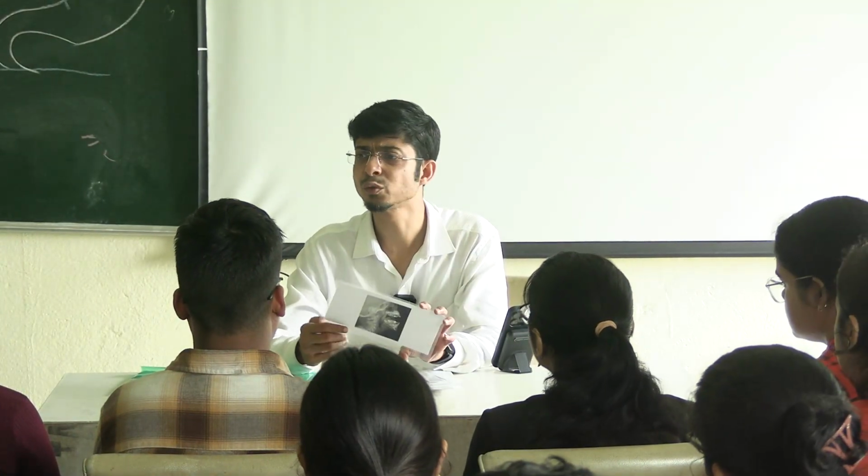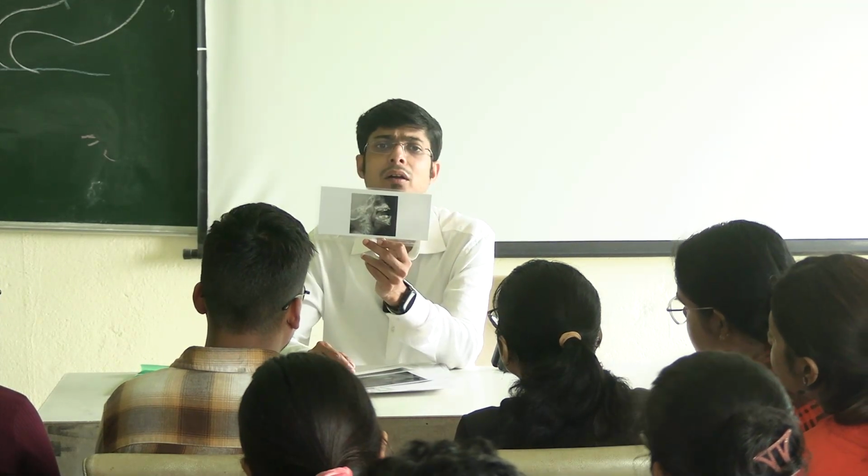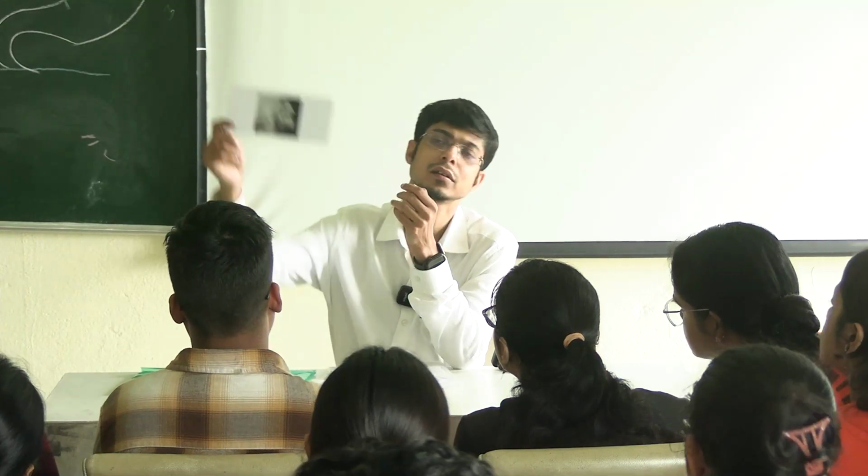Yeah, so this X-ray, we asked this X-ray to a lot of students this year. No one could answer properly. I don't know why. This is a very, very easy one. What is this? Someone from the back volunteer, please.